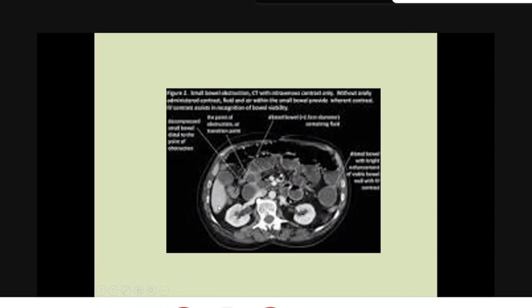هذا CT scan of the abdomen. You can see there are multiple dilated fluid and gas containing small bowel loops. هاي هنا dilated أكثر من 2.5 سنتيمتر. وراها اجت عندي هنا the transition zone اللي راح تفصل لي between the dilated and the small caliber bowel loop. وهنا رجعت عندي the non-dilated or collapsed bowel loop.